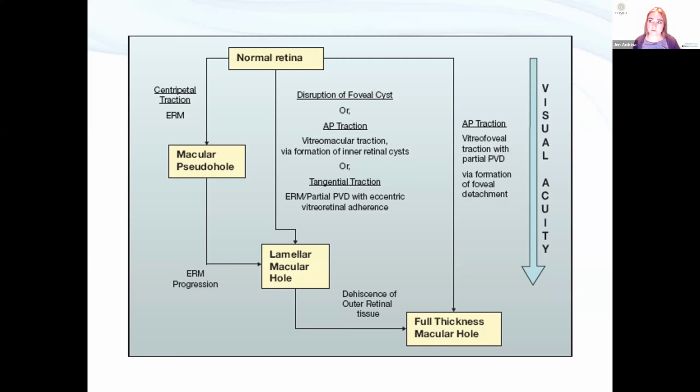All of these vitreomacular interface disorders, we think that the vitreoretinal interaction plays some role in them, but we don't fully understand what role, because as I said, with lamellar holes, you often don't see any traction with them. Is it that the traction happened earlier to initiate it, and then the split has just kind of gradually unzipped? We don't know, because some of them you pick up and you see they get a bit worse without any apparent traction. Maybe our imaging is not good enough to pick up very fine traction yet. We don't know. That's the answer.